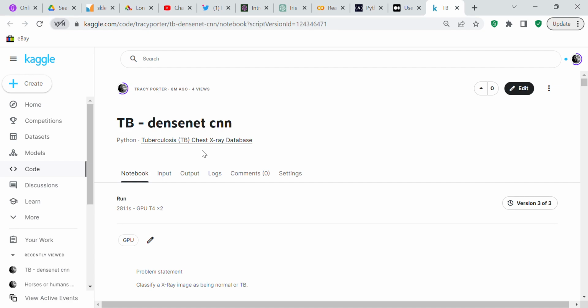And it was a lot more difficult than it appears because you had to set up the correct settings for the model, and then you have to set up the correct settings for the compiler.